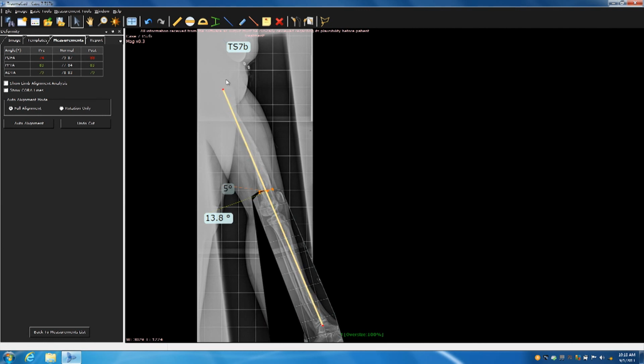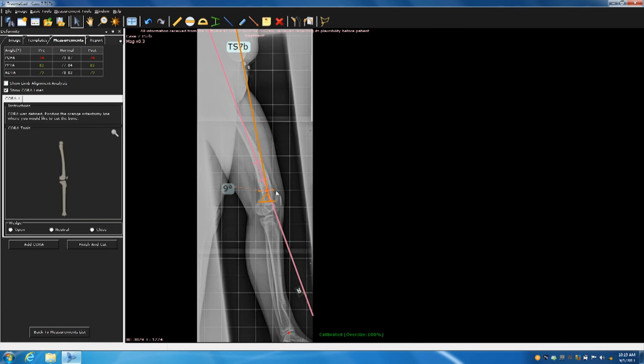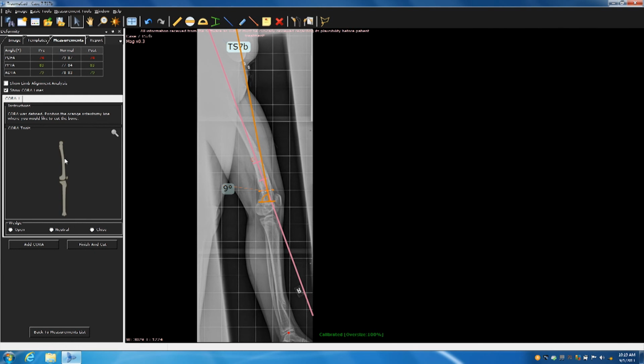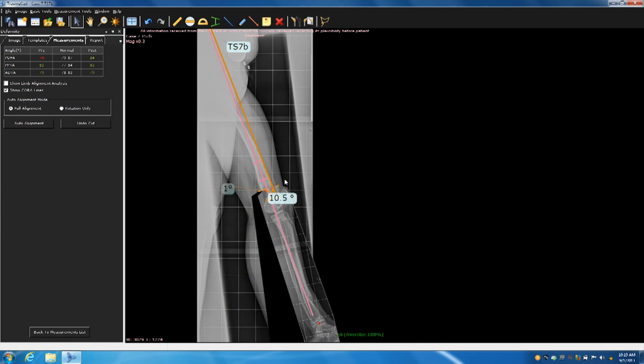The other thing you can do, what's nice, is intentionally mess up and see what happens. And this is a great educational tool for residents as you go back and decide, okay, undo cut. Let's take our little hinge point and put it up here, and what happens? You know, finish and cut, auto align. Oh, I'm sorry, auto align won't let you mess up. Undo cut, finish and cut, you have to grab your segment and rotate and say, okay, if I want to do this, this is what's going to happen. And you can see as you rotate farther, you're getting the translation that we talked about.